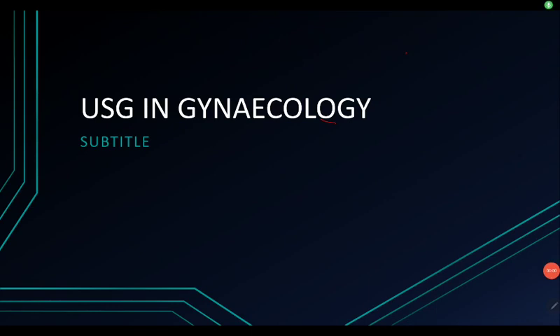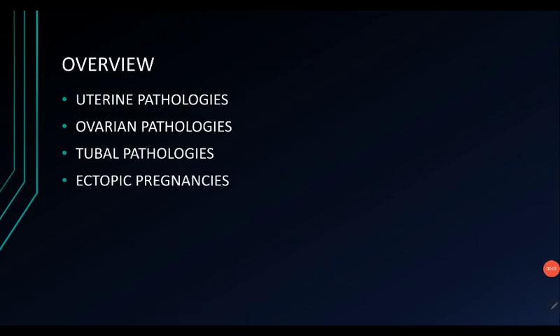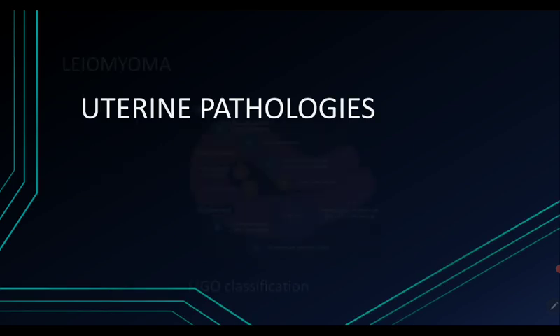Today we will talk about ultrasound in gynecology. In the overview, ultrasound is used for uterine pathology, ovarian pathology, tubal pathology, and ectopic pregnancy detection. First is uterine pathology.